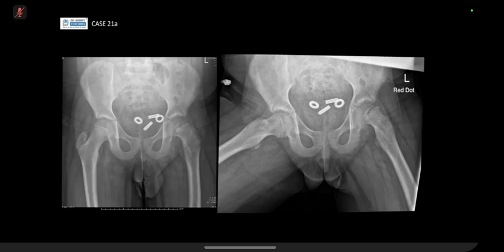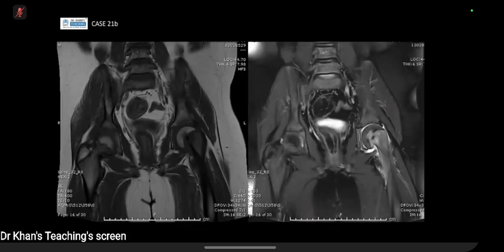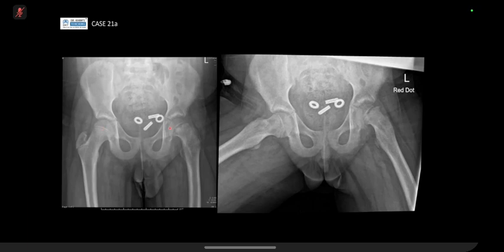Okay, so you've got an MRI that was done. Does it confirm or refute your diagnosis? Yes, it confirms. The femoral head epiphysis is subluxed posteromedially with joint effusion, and findings are suggestive of slipped capital femoral epiphysis. Yeah, good, so exactly what you said. There's asymmetry of the physeal line. So you've got widening, sclerosis, and most importantly, you've got the slip, which is best identified on the frog lateral view.